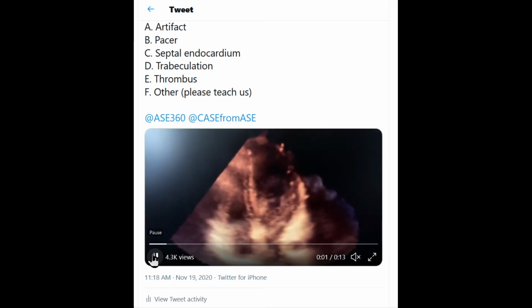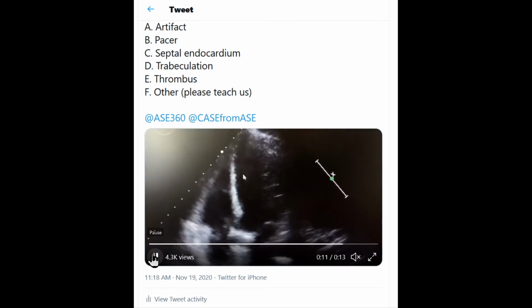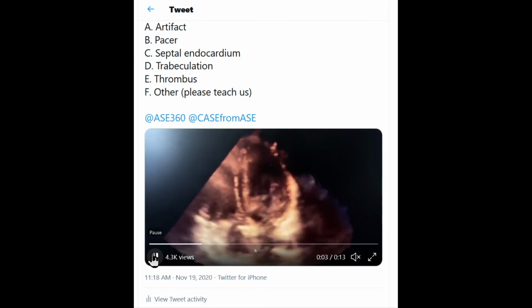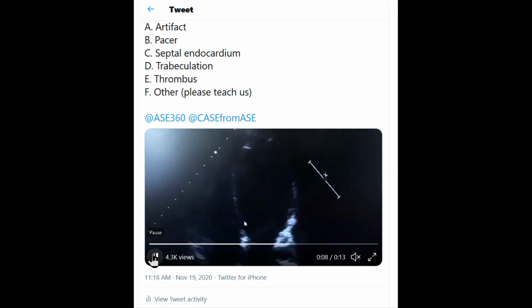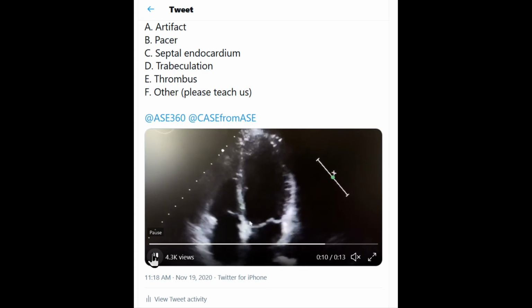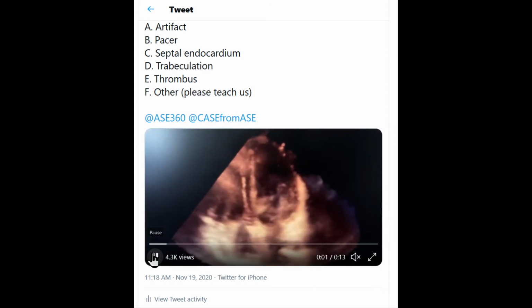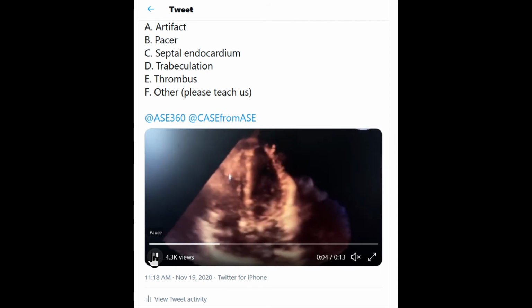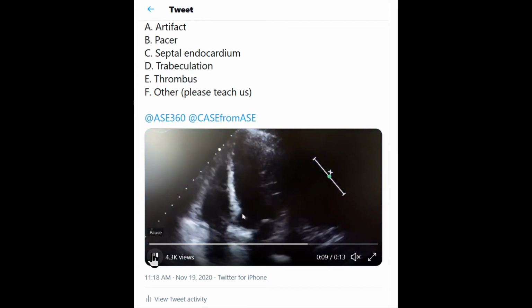Julian said that it's MIP, which I thought was interesting. MIP is a term that we use in cardiac CT or radiology, maximal intensity projection. It's basically normal muscle that's displayed in 3D because you have thicker acquisition slices, and that's why you don't see it as much on the 2D. Eli similarly said it's just the normal endocardium of the septum, seen better on 3D instead of 2D. Matthias asked for more views and wondered if that was cheating. It's never cheating to ask for more views, and I agree that that's always a good option.